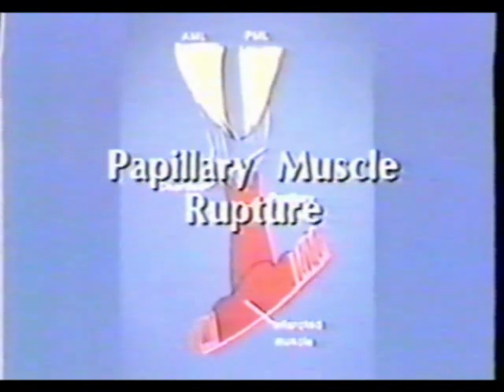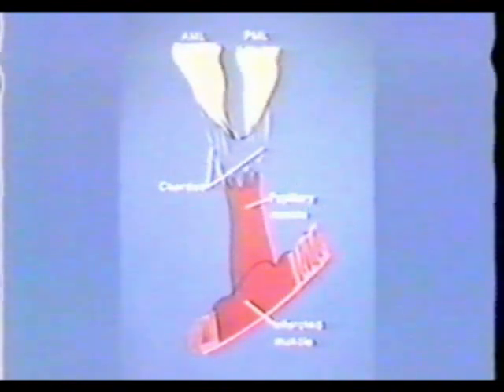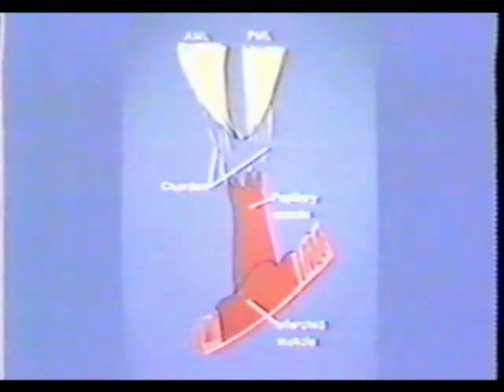During acute myocardial infarction, there is frequently associated infarction of the mitral papillary muscles. The tricuspid papillary muscles are much less commonly involved. This is a schematic of an infarcted posteromedial papillary muscle. Infarction of the muscle usually results in dysfunction leading to mitral regurgitation, the severity of which may vary from mild to severe.